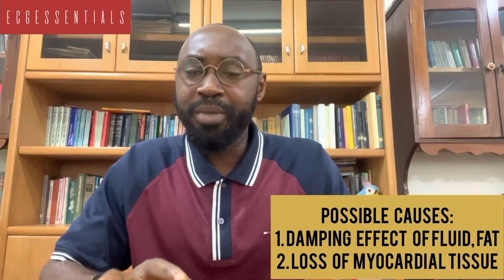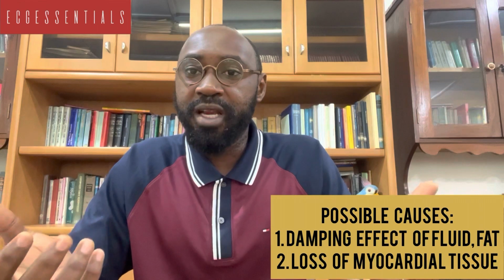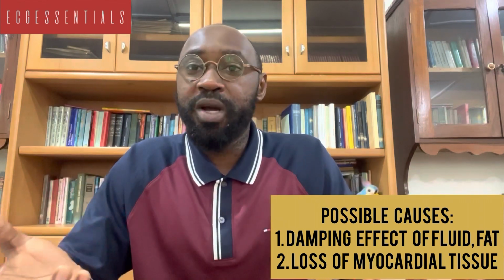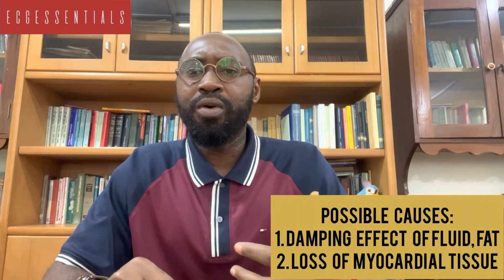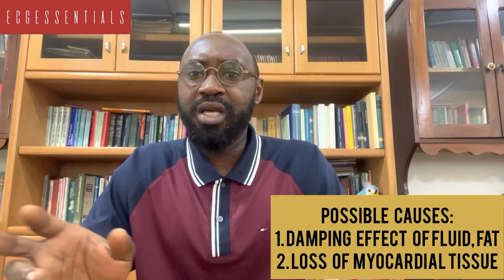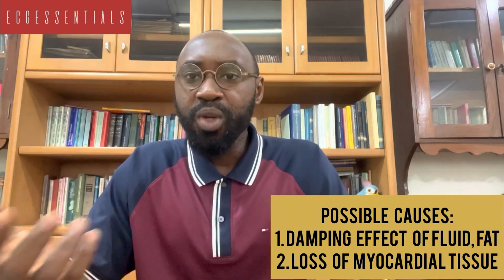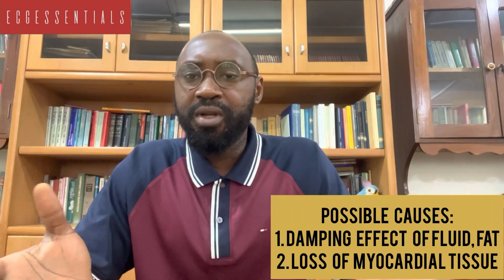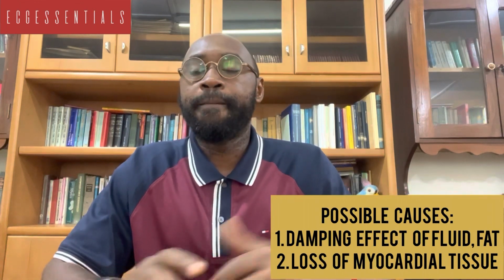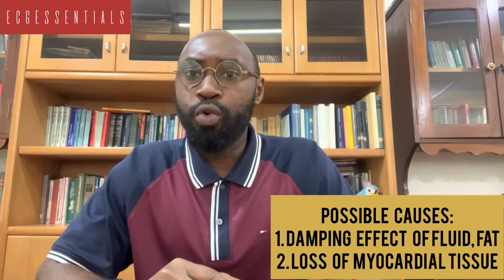If it is not a damping effect from fluid or fat, the other thing that may explain it is loss of myocardial tissue. So maybe the person has had a prior MI or is in the very last stage of, say, a dilated cardiomyopathy, where the muscle activity is very minimal. In such cases, the QRS complexes may be seen as low voltages.